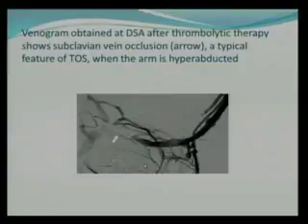There is nothing left. All you need to do is an MRI right now to see what is causing the impingement, what structures are causing the impingement, and finally take the patient to thoracic surgery, who will relieve the patient of those impingements. So very important case here, and I want you all to understand that the venous collaterals start filling up as soon as the patient's subclavian vein is occluded by compression.